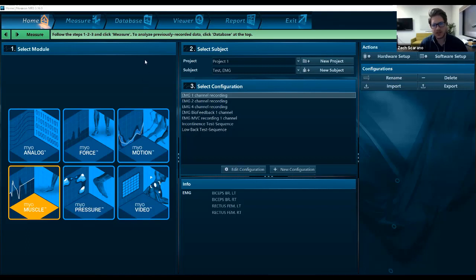And so I first want to get into discussing the ability to apply the signal processing in real time. This allows you to utilize different signal processing techniques and have those be applied to the signals ahead of time, so that as you continue using that selected measurement configuration for any measures, you'd have that same processing techniques applied to those signals every single recording. And it really helps make that overall workflow very efficient, because you don't have to manipulate or edit anything on the back end. You simply can just move right into the analysis side of things.